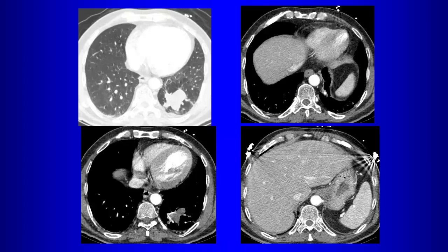A CCAM? Yeah. Any other clue? What did you mention? So what would you look for? Do you see anything that fits the bill?